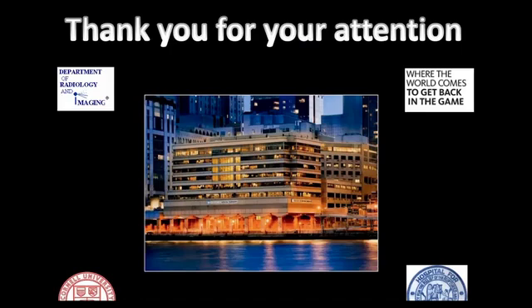So what people are advocating is you sometimes put a range in your MRI. What I prefer to do is describe it as multi-level spondylosis, and then in the impression I only include things that I think are likely to be symptomatic. But I think that the other concept is good too.